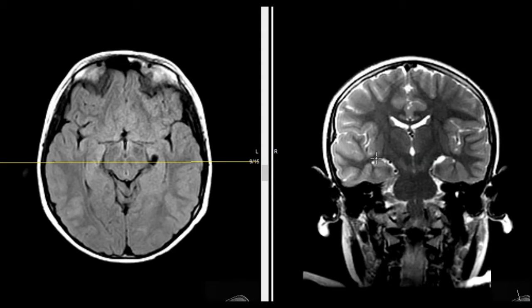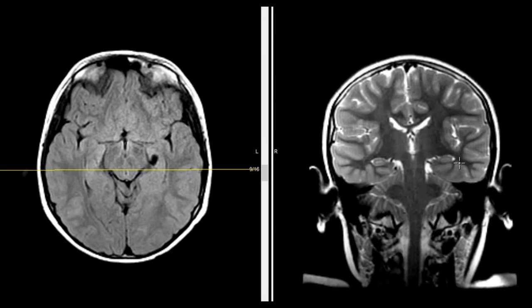And we look right above it at the fissure here. This is called the choroid fissure above. This is completely normal. On this side, though, we see that the hippocampal formation is pushed downward. And instead of having a convex outer surface, it has a concave surface superiorly. And the little fluid collection here is pushing down on that.